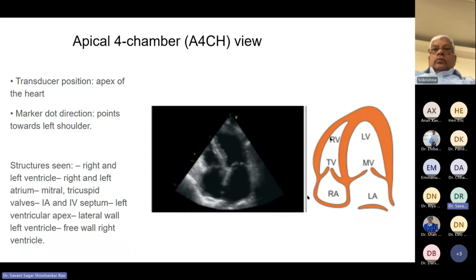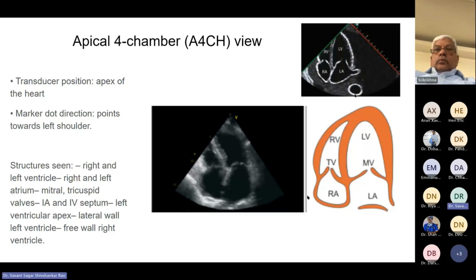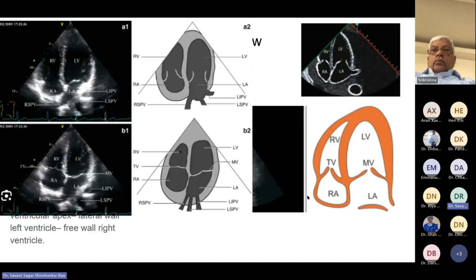Going further into detail of the four-chamber view, on the right top side of the left atrium we can see the descending thoracic aorta. Further, going into the detail of the left atrium, we can see the right superior pulmonary vein, left superior pulmonary vein, and inferior pulmonary vein. This helps in determining that the left atrium is morphologically a left atrium, because it is receiving the pulmonary veins.